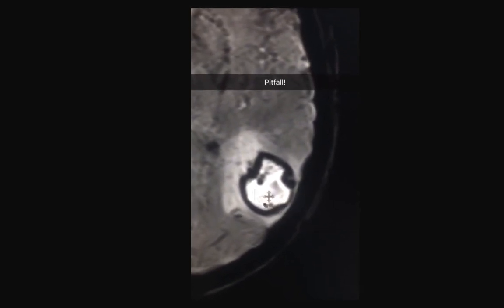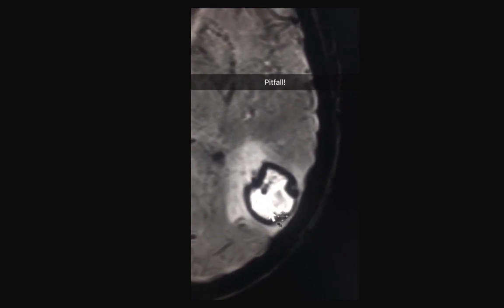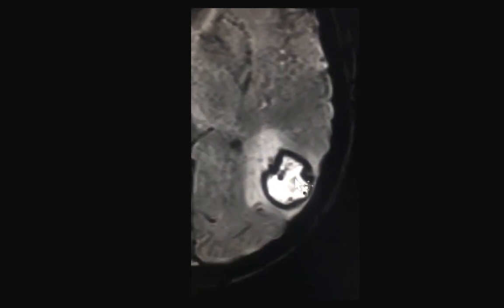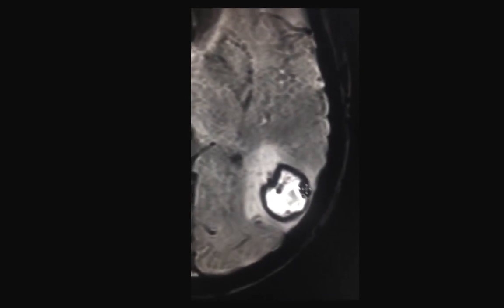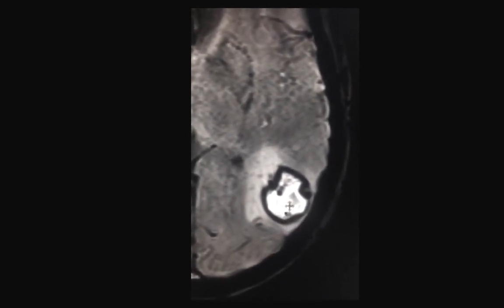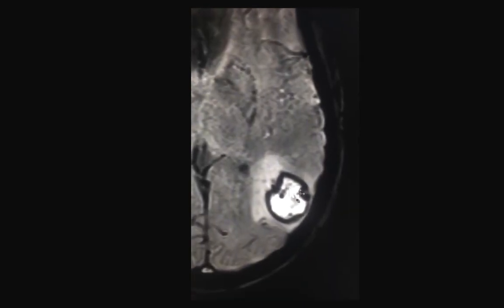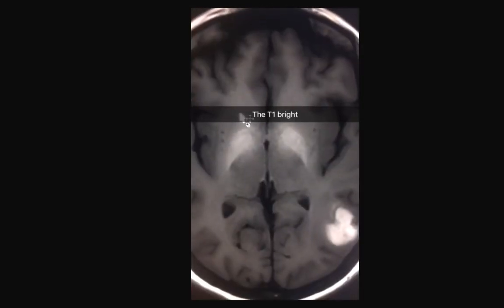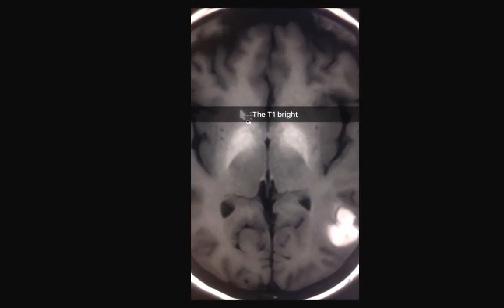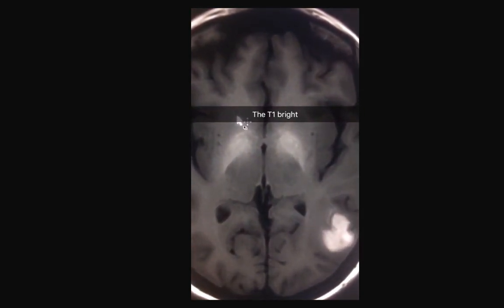I would direct your attention to the center of the bleeding, which we described as being subacute in nature. As a radiology resident, especially seniors, you have to remember that late subacute bleeding does not give you susceptibility artifact. To make this easier to remember, let's go over an important fact. You remember how we said on the T1 image that bleeding is bright in the early or late subacute and it's iso or hypointense otherwise?